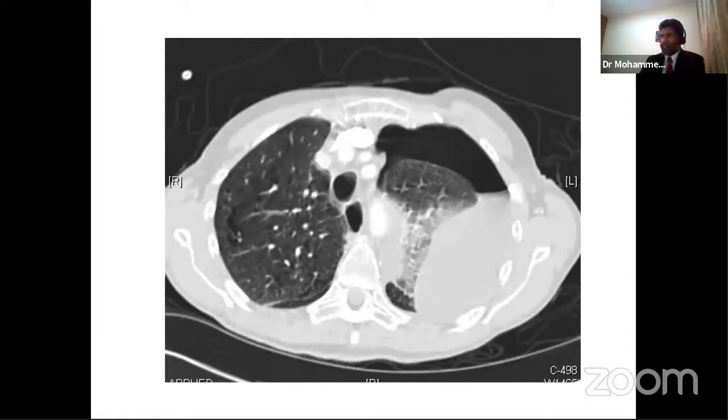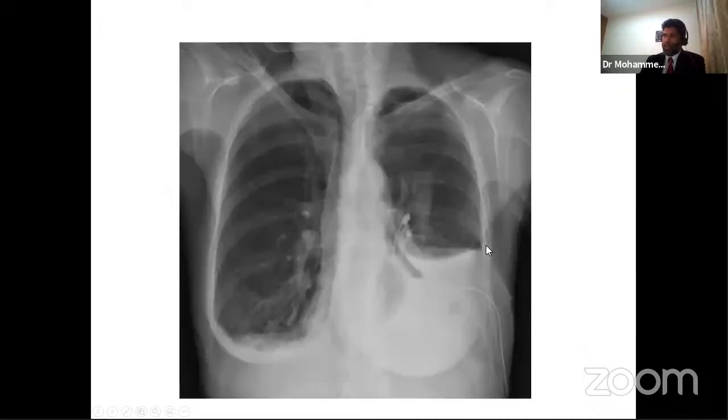The patient had a CT chest. CT chest did show air within the left hemithorax with pleural effusion. This patient went on to have a chest drain, and bloody effusion was drained. It was towards the end of the evening, it was a weekend, and I still didn't have a reason why the patient had hydropneumothorax, or how the air got into the pleural cavity with no previous history of pleural intervention. The possible causes would include external trauma, or a previous intervention, which the patient didn't have.